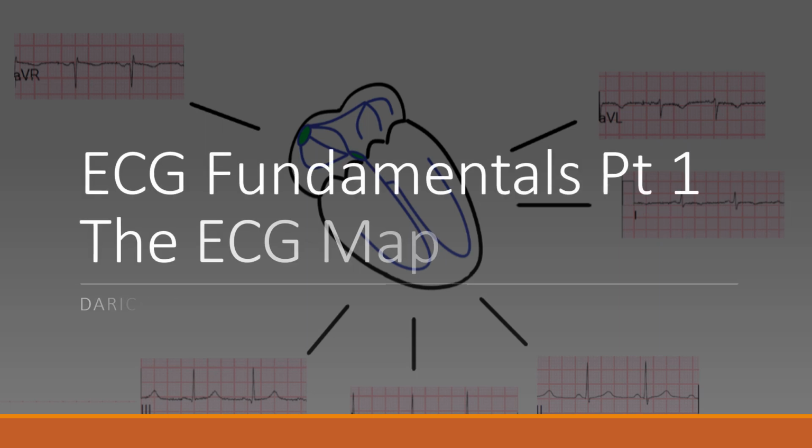All right, on this episode, we're going to do part one of ECG Fundamentals. I was going to try to make this all one video, but it just came out too long, so I'm going to break it into a couple different shorter videos, make it a little bit more digestible. And so I wanted to start with something I think is probably one of the most important foundational elements to ECG interpretation, which is just building an ECG map.